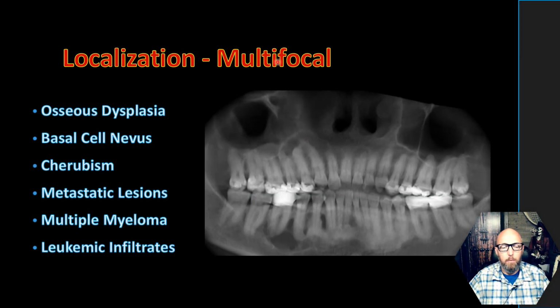All right, and when you do get a multifocal presenting lesion, why is this one multifocal? We see something right there. This may be associated with it, but it looks like it could just be a pseudocyst. But then we also see in the mandible, it's extending all the way across the periapical region of these teeth. That one on the last slide, I just said what occurs in the periapical region of teeth, periapical cemento-osseous dysplasia. There's one in this part of the maxilla as well, right around the apex of tooth 9. And so this is just the florid variety, one of the varieties of osseous dysplasia.